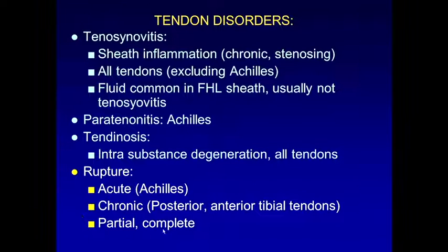We're going to look at partial versus complete, and finally we're going to look at dislocation, and that's most common in the peroneals, less common in the posterior tibial tendon. There are actually reports of flexor hallucis longus dislocation as well.